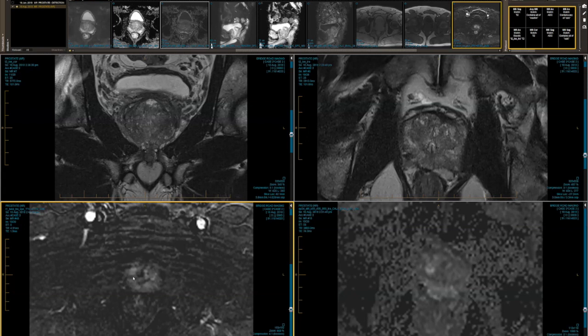Veeru, any comments before we go to the next case briefly? Yeah, if I saw that MRI and I was in theatre about to do a biopsy, I would say the same as Richard. It looks a bit unusual, whether it's in the peripheral zone or the transition zone where there's a bit of uncertainty, but it does look a bit unusual. It stands out to me. I would probably say that would need a biopsy.